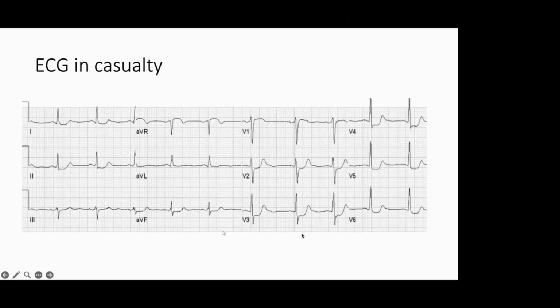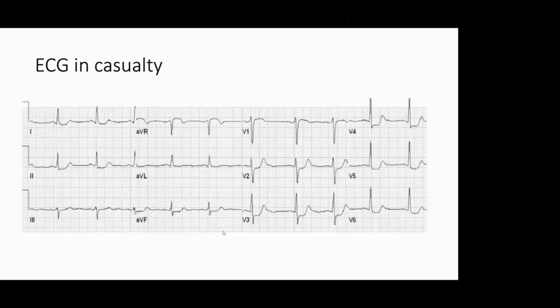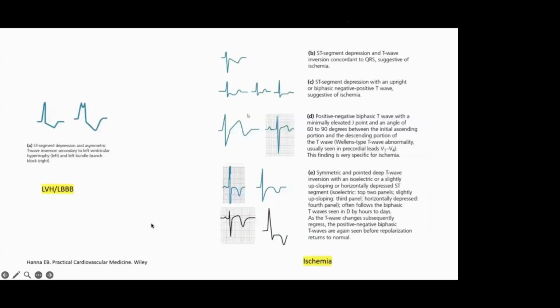In a patient with LVH, it will not be like a normal patient. You have to see the old ECG and the new ECG. When in the old ECG there is ST depression with T inversion concordant with it, that is the strain pattern. But when there is ST depression with an upright, discordant T wave, you should be very careful in these hypertensive patients with LVH. This is highly suggestive of ischemia with reciprocal changes in other leads and evolving myocardial infarction.